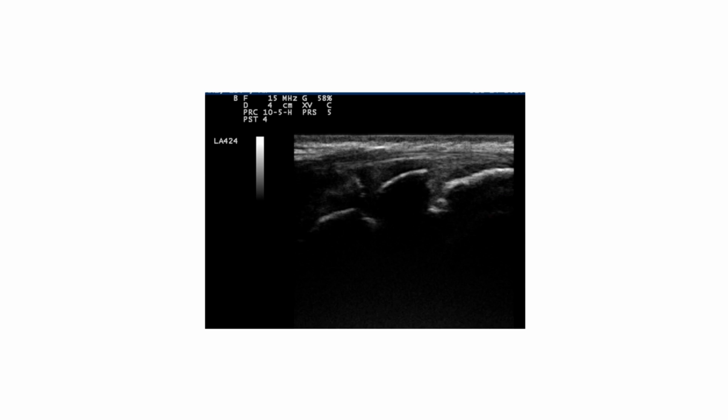This figure is an ultrasound image of Osgood-Schlatter disease in a 6th grade elementary school boy. Damage to the tibial tuberosity and cartilage can be observed. Cartilage appears dark because it is observed with low echo.